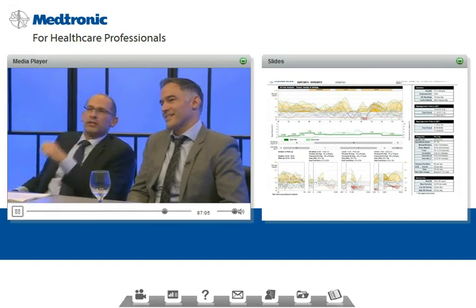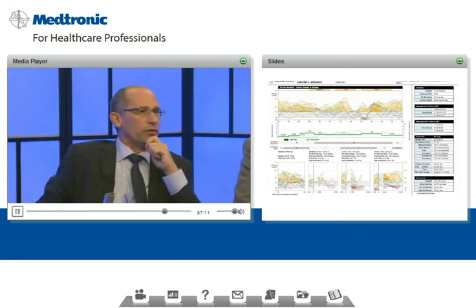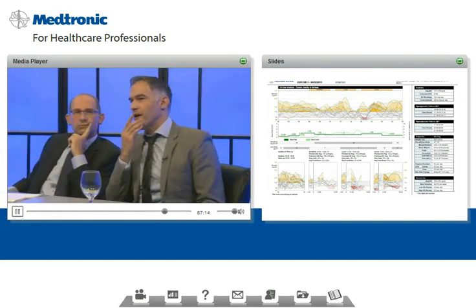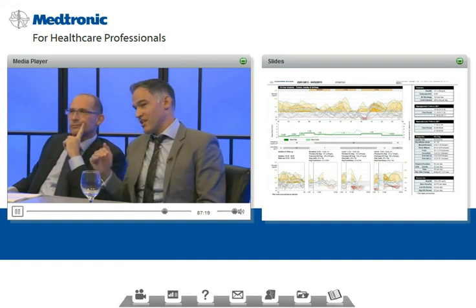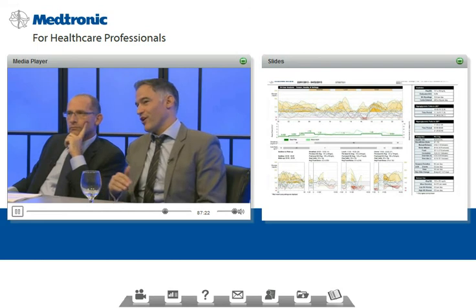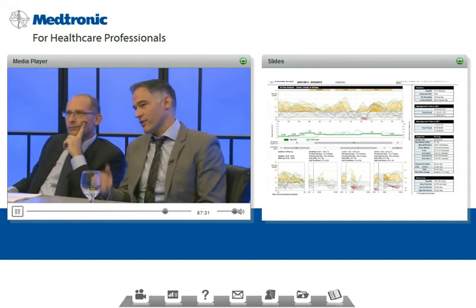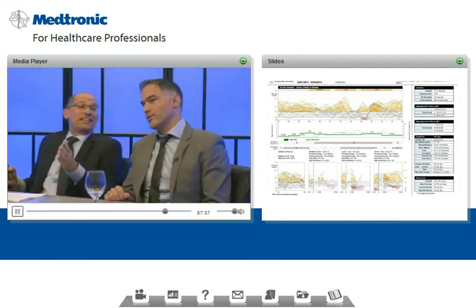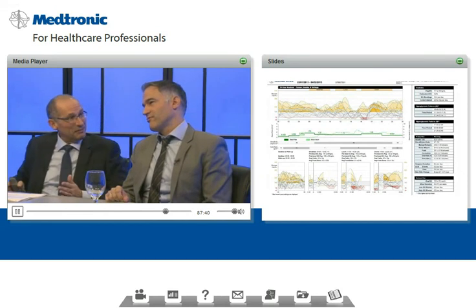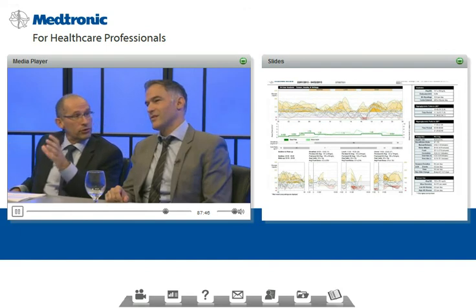Why did you first look at the overnight basal? I'll keep it brief, but you could argue either way. The blood glucose is pretty stable through the night. The average line is very stable. But overall, she's struggling with overnight control. It would make some sense to have a bit more overnight basal because they're not on target over that time period, nor for the fasting blood sugar. So first of all, it's the easiest way to approach: go to the overnight glycemic control. It's clear, it's there, it's very easy to address, and it needs to be addressed.